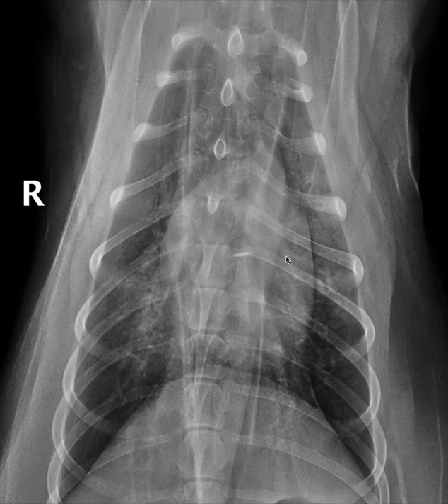Okay, so on the ventrodorsal view, the reason that I like this is we can get a bit of a sense of increased opacity in the lung that's distributed not diffusely, but in particular locations. So you can see in the left cranial lung lobe here, maybe slightly worse in the caudal subsegment, we have diffuse increased opacity. We also have increased opacity here in this region. This is the location of the right middle lung lobe.